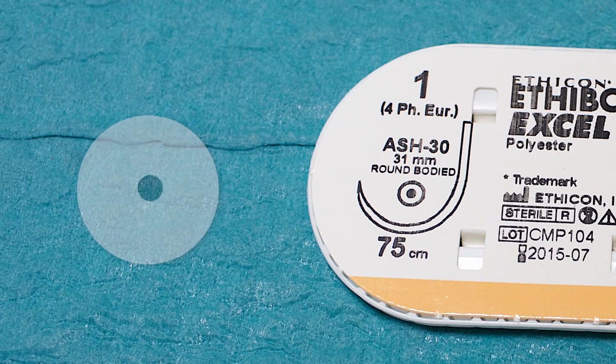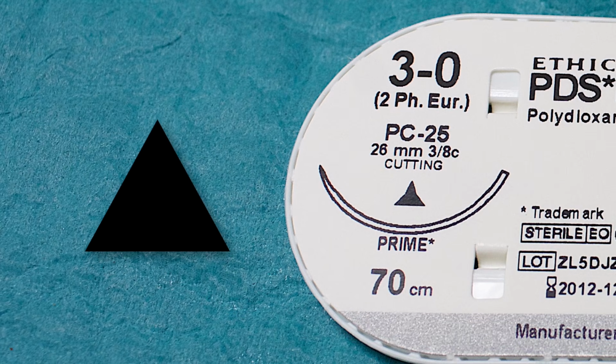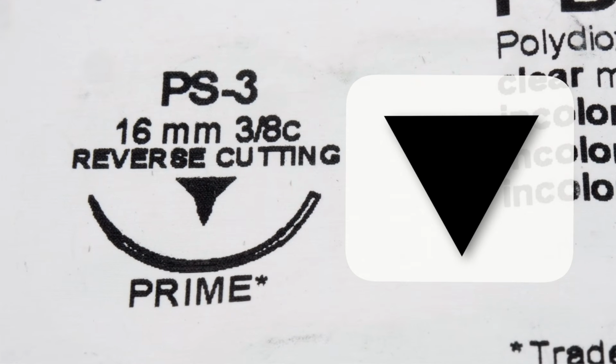For round body needles, they will have a white circle with a small black circle inside. Cutting needles are indicated by a black triangular symbol, with the apex pointing towards the 12 o'clock position. Whereas reverse cutting needles have a black triangle with its apex pointing towards the 6 o'clock position.